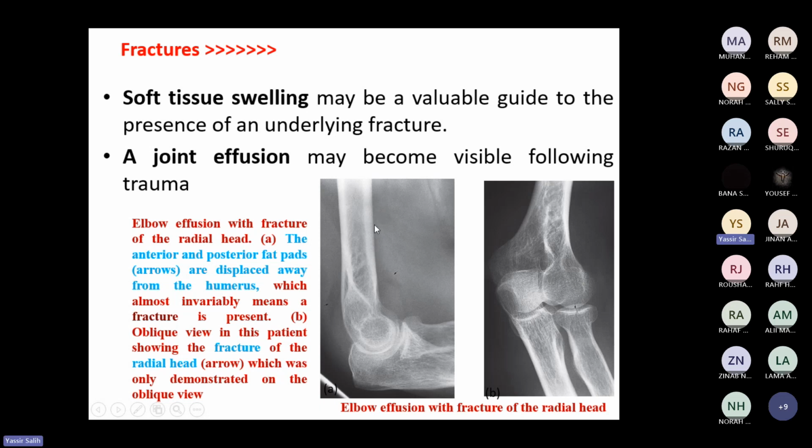Follow this density just near or close to the cortex on both sides, medial, posterior and anterior. But at this point the fat is displaced. لاحظوا الخط ضيق. This fat density normally should be close to the cortex till down. لكن if you follow it, till this point the fat density is against the cortex, but from here it is displaced. لاحظوا الخط الأسود ده الفات المفترض normal يكون close to the bone, displaced anteriorly, and also in the posterior aspect. If you go, you can see this density. This is the fat density, also displaced posteriorly.